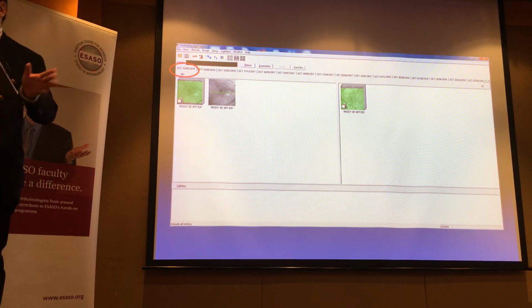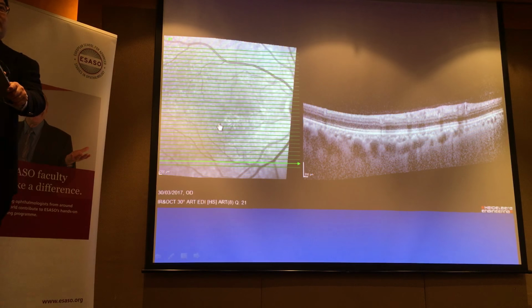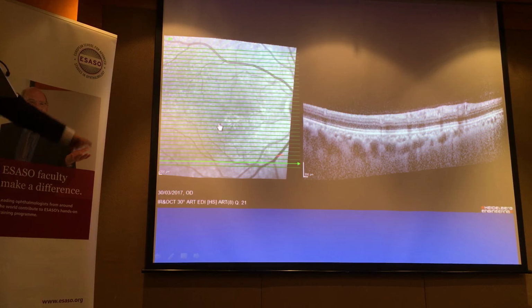So when we look carefully, it was visible. There was no edema. See, again, you see what you're looking for. They were looking for fluid. They were looking for cysts. They were looking for thickening. They didn't see that pre-retinal hyperreflectivity, which was the hemorrhage. So unfortunately, I can't recall that patient, so I can't find the scan to show you. But trust me, I think you can imagine what I'm describing. All right, this was the first clue. Now, if I had examined, would I have spotted it? I hope so. But the fact is, it was a difficult patient. Okay, but this makes you look more carefully.